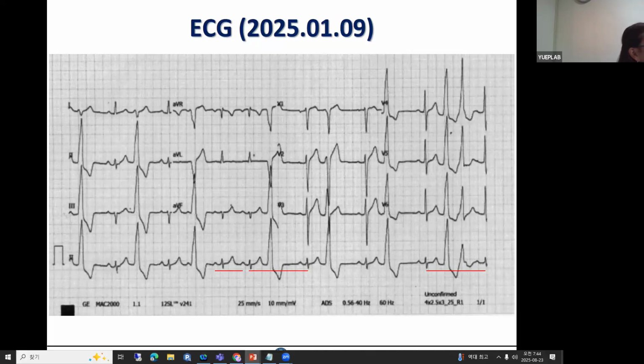Why? I think in V1 there is a negative QRS complex. It comes from the right side. But yes, V1 is also negative. It may come from the right side. If you look really carefully, V1 is naturally all negative. There's a small R, and then it goes down, and you can see the activation is very sluggish at first. If it were the right side septum, it would be a very sharp drop.